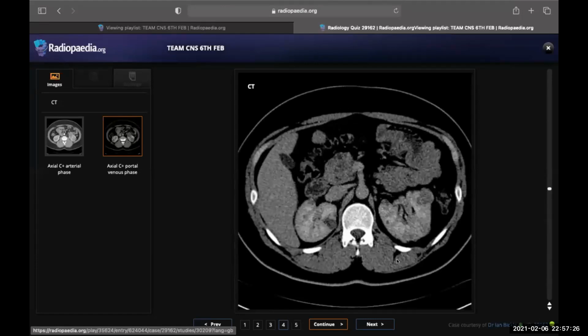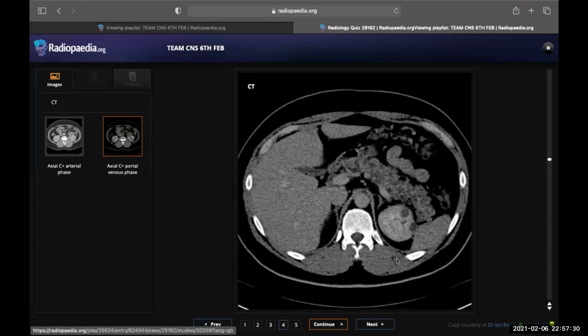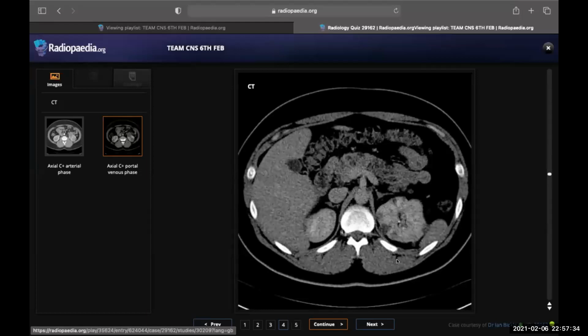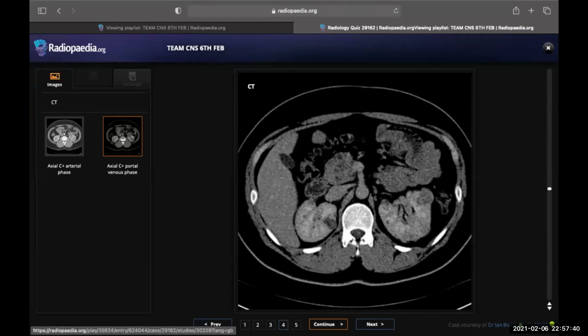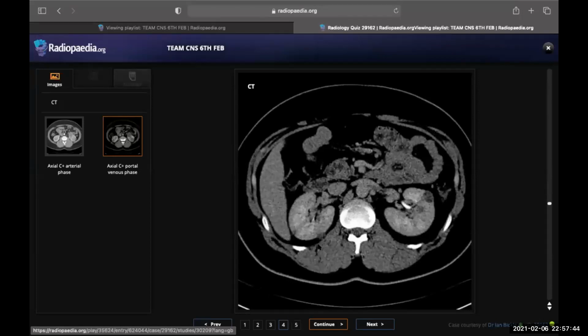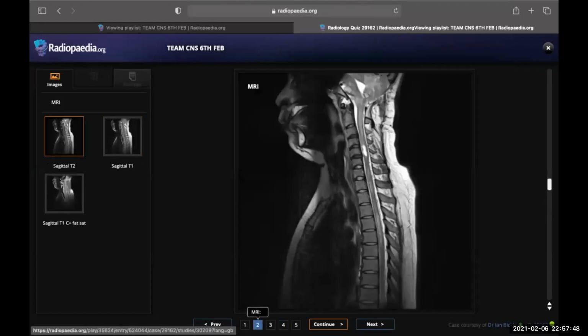The adrenals. Okay, I'll show you the adrenals. And pancreas. Yes, so tell me what is in the pancreas. Very good. Pancreas, I have multiple cysts. Excellent. So what is the syndrome? Von Hippel-Lindau. Excellent, Dr. Sulafa. Very well done. I know I hurried you up because I wanted to finish the case, but you did very well. So I did not revise for a long time. No, you did very well.